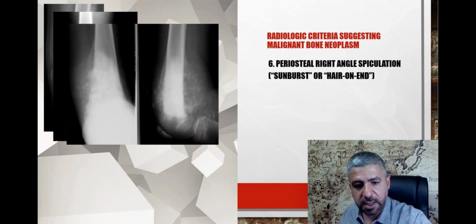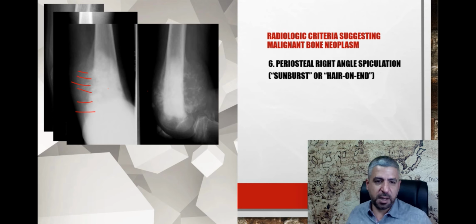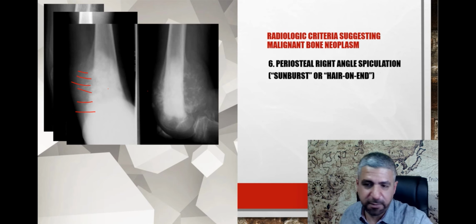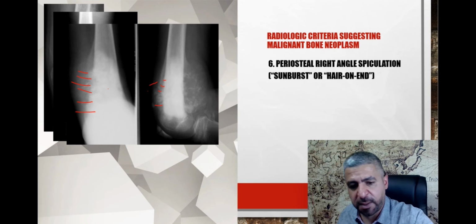Let's look at another example. You can see it's a very romantic sunrise, sunburst, or hair on end appearance. Of course, unfortunately for the patient, it's a malignant lesion, and there's nothing romantic about that.